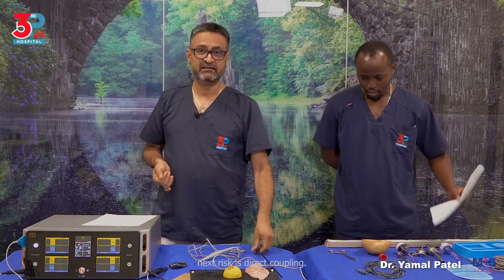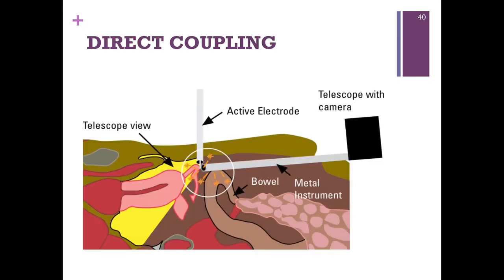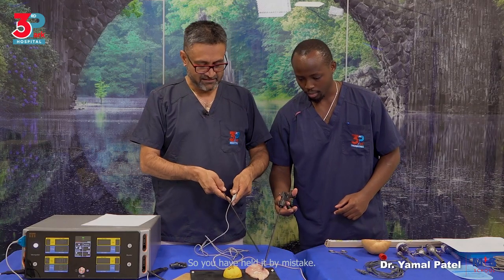Next risk is direct coupling. So what is direct coupling? Bring that instrument and touch this, just hold it somewhere. So you have held it by mistake.